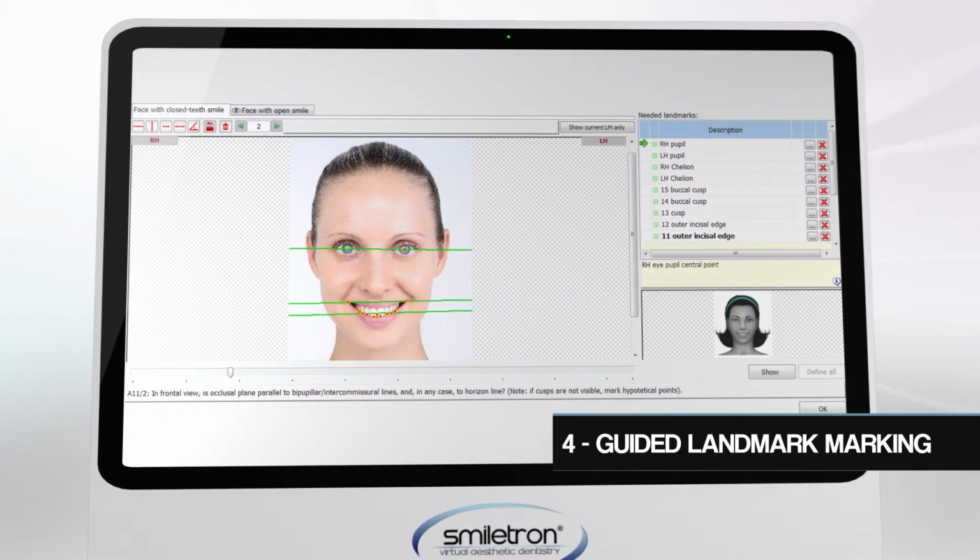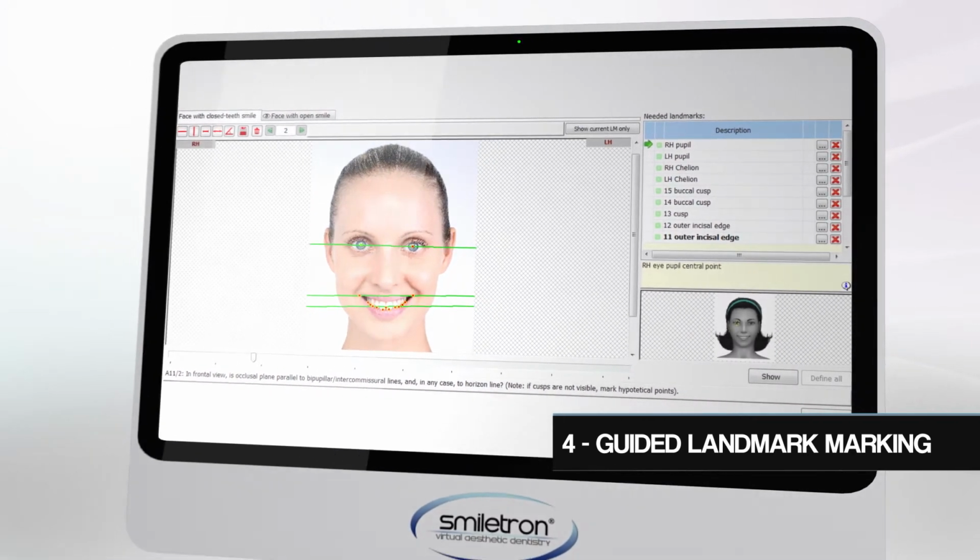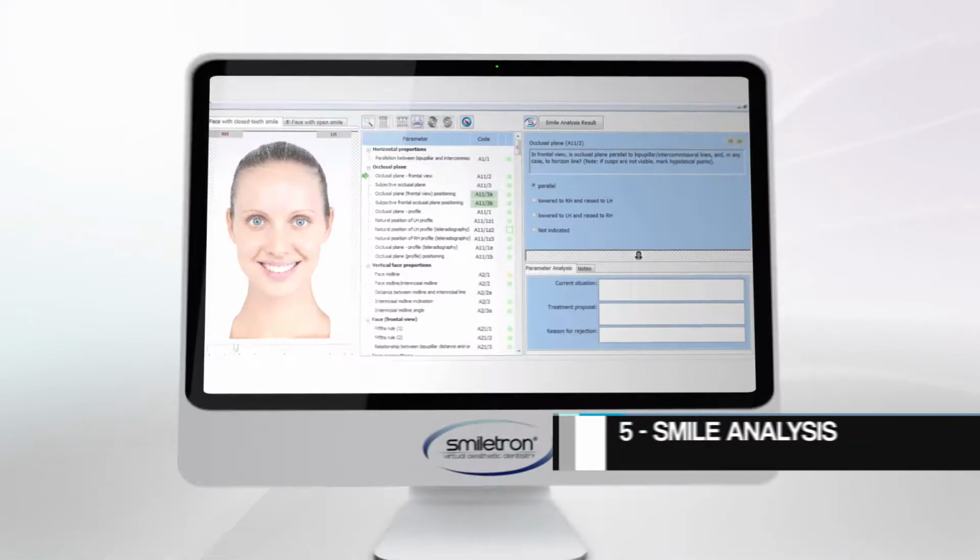What if the specialist is short on time? You can ask the SmileTron service to make the preparations so that the test can soon be visualized on your PC. The system is now ready for the automatic smile analysis.